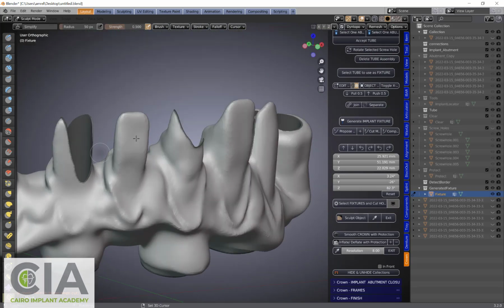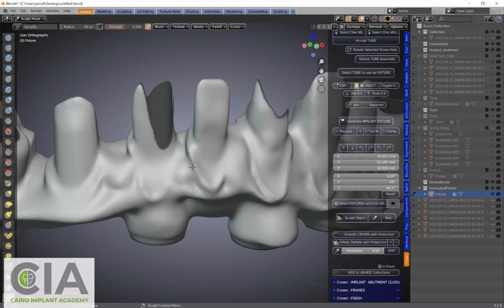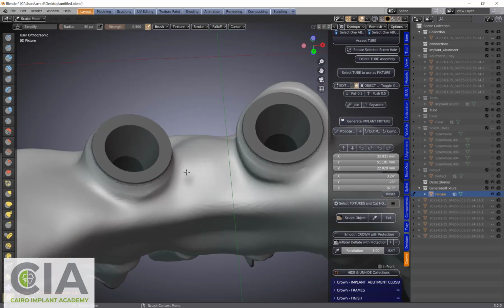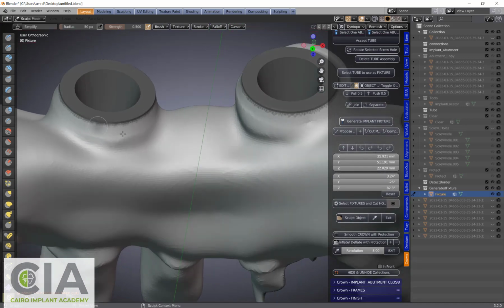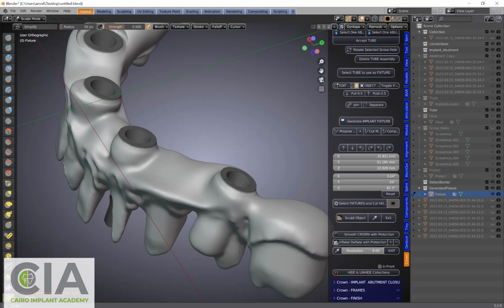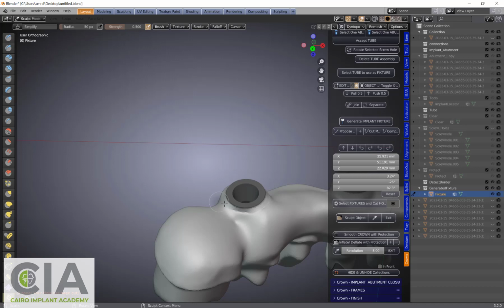This is much different than the initial corrupt mesh. You can see we have very good control over the parts here. The meshes here are very clean, very nice. I can just go swap a little bit everywhere just to make it as smooth and as good as possible.